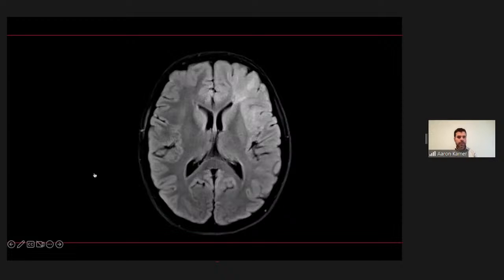All right, let's see. Who else should I pick on? There are 2 pages that you can choose from. Okay. So many people. So Wyatt, I am going to pick on you, even though this is your second day of neuroradiology. You've only done one day. Can you guess which sequence we're looking at here?